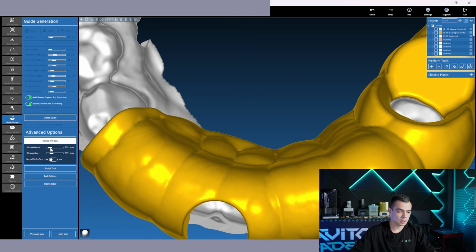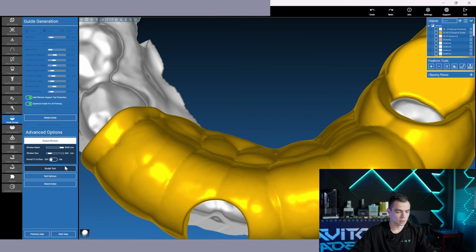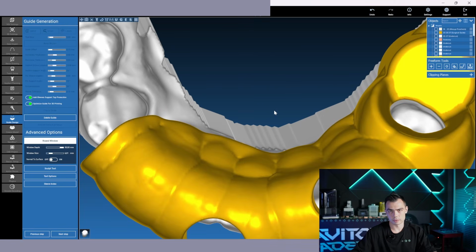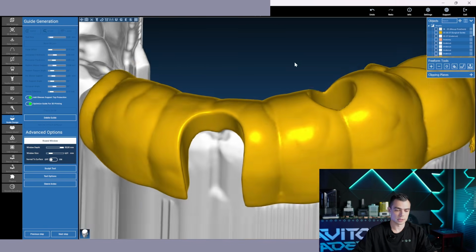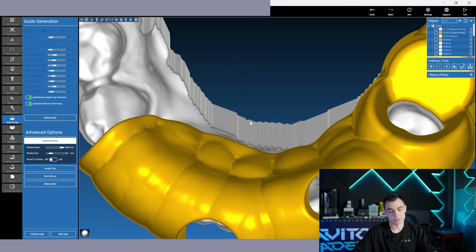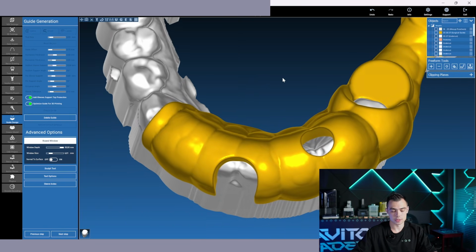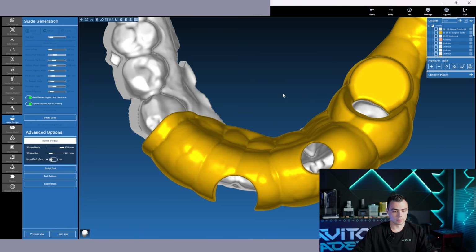Sometimes you can see windows like so, but I don't know what you can see there. Anyway, you have to use mirrors, you have to look somehow into this window in order to estimate, but to my mind these vestibular windows are more suitable for such purposes. But anyway, it depends on the doctor and the preferences.